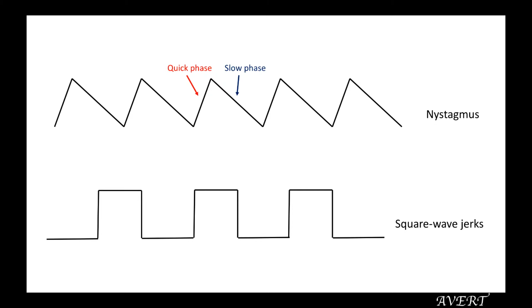However, nystagmus indicates dysfunction of the vestibular system, whereas square wave jerks often occur in healthy people. If the software's analytic system shows a nystagmus greater than 10 degrees per second, but the VOG graphs at that time show irregular waves or silence, it is considered noise and should be excluded.